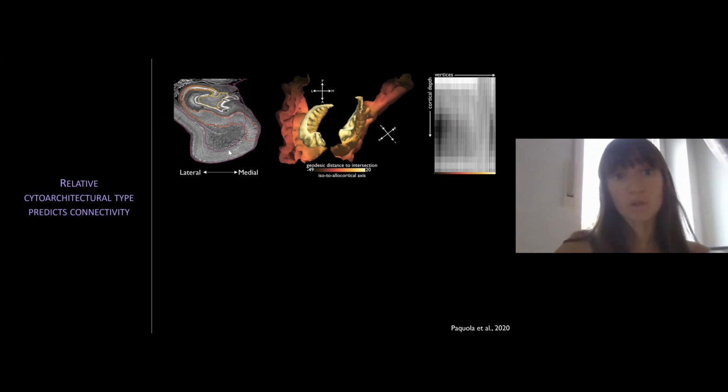So we took this isocortical model of BigBrain, so you can see that in purple there. And we also combined that with a manually segmented version of the hippocampus that comes from Jordan DeKraker and Ali Khan at Western. So here you see this in orange. And one of the very cool things about this hippocampal model is that they also produced internal axes within the hippocampus that tell you which way is the inner and outer part of the hippocampus. So that aligns with the pia and white matter boundaries of the isocortex, and an axis for proximal to the entorhinal cortex or distal. So distal would be deeper in the hippocampus, more dentate gyrus.